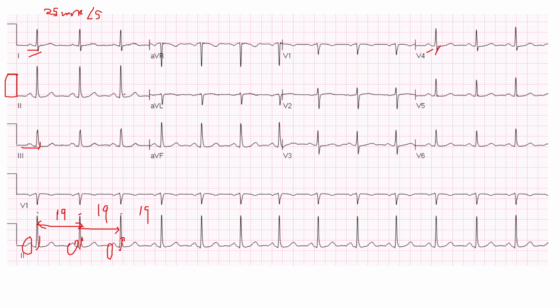Then let's move to the next step. We have the PR interval. It will start from here to here, but let's be more in detail. This is almost on the line. So in this case, we have 1, 2, 3, 4. 4 small boxes, normal. We said between 3 to 5 is normal. So normal PR interval. Then we can go to the QRS complex. The QRS complex is almost two small boxes because you will count till it comes back to the isoelectric line. It's two small boxes, normal. Then you will move to, for example, the ST segment.